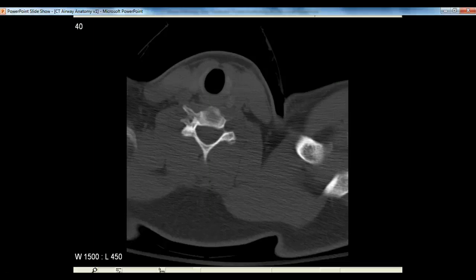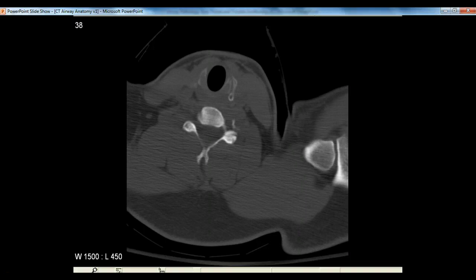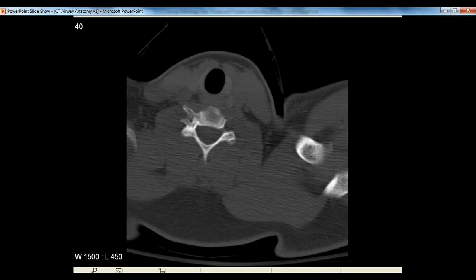the trachea. But I want you to take a look at the space between that ring and the bottom of the laryngeal cartilage. There's a laryngeal cartilage, it stops, there's a little space in that ring structure there. And if you take your finger and you slide it down your laryngeal cartilage, you'll find a little divot. If you push on that, it feels soft, and then there's a solid structure behind it. That's called the cricothyroid membrane, and that is the space that we would cut a hole through if we needed to access the airway below the level of the vocal cords.